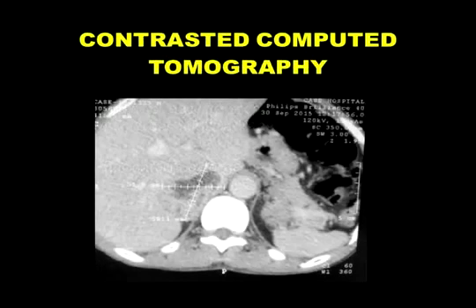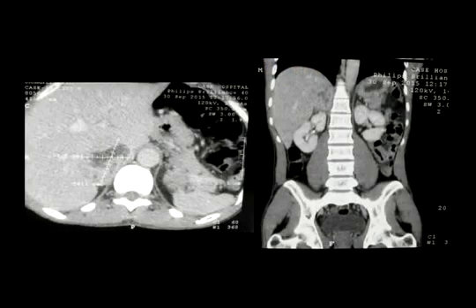This patient as well had a CT scan done, and this is an axial contrasted CT scan image, and we see that relatively ill-defined mass, because I cannot easily tell its margins, but with a central area of necrosis and a solid area that highly takes up contrast. The same mass on the right suprarenal area, and this is a coronal image as well.